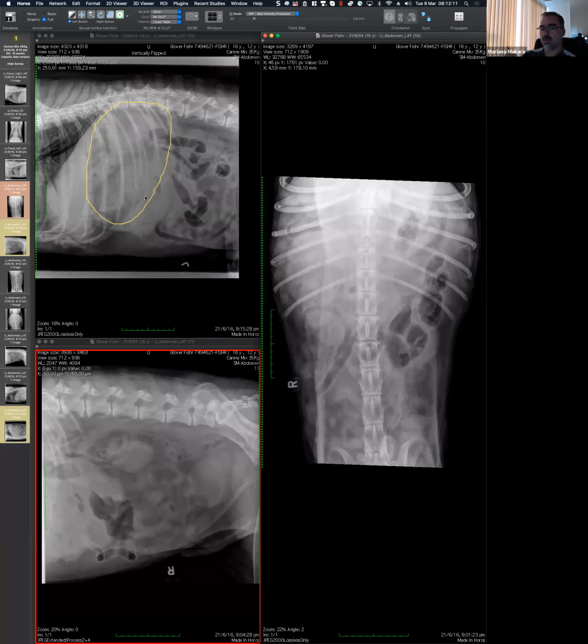You can try to describe it and use the different features: the size, the shape, the opacity, the location, the margination. So you can say, is that bone or metal or soft tissue or gas or a combination? How big is that? How well defined? Where is it located? At the end of the day, the more you can describe that, then even unconsciously, you're already removing some of the considerations that may come to you when you first look at the images.